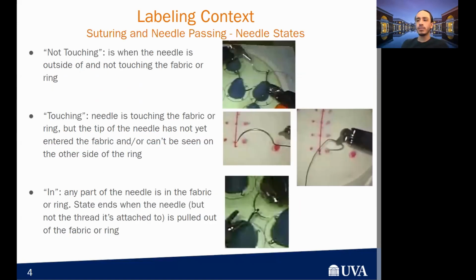Not touching is what that implies. The needle is neither touching the rings nor the fabric. In this picture here, it might seem like the needle is still inside of the ring, but that's actually the thread. And when you're labeling, this will become apparent based on context.